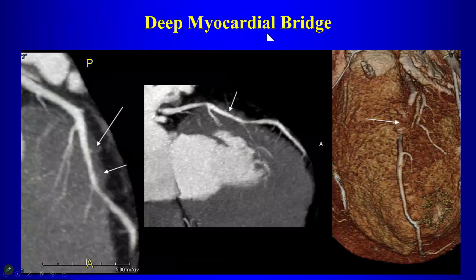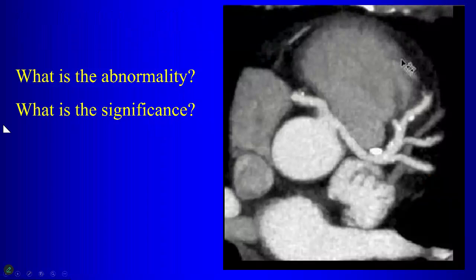This is what we look for. So deep myocardial bridge, if it dives deep into the myocardium, that's certainly something that has to be looked at. Okay.